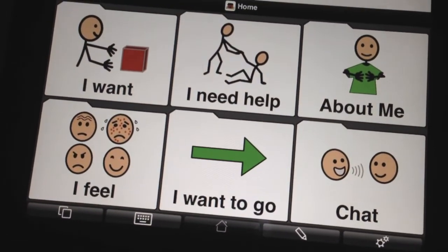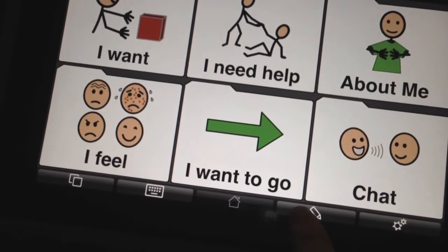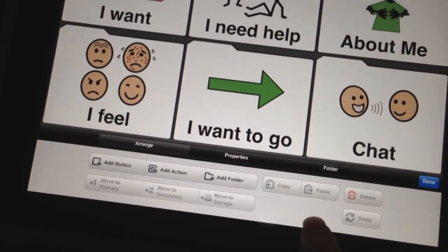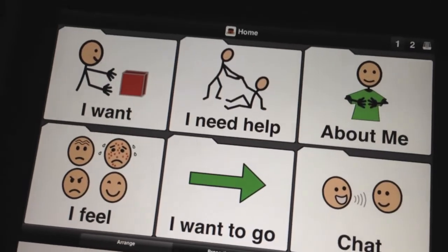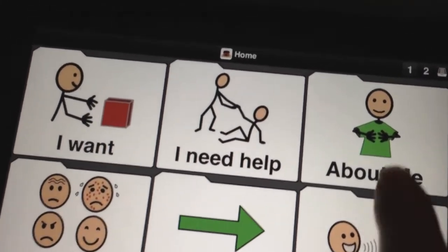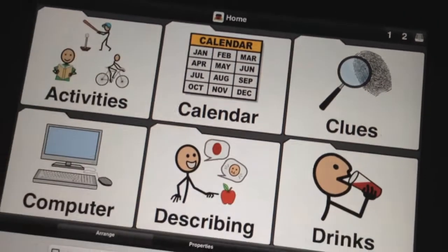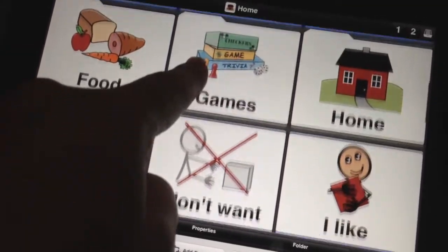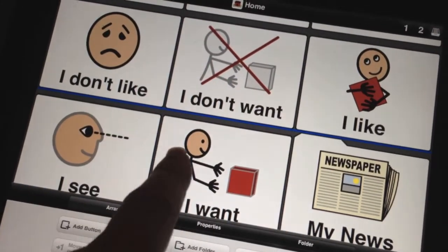or if you wanted to, what you could do is go down to your pencil button, your edit, and you can look in something called storage. Storage puts everything that they think could be used on this page in a little file cabinet for you. So you're going to press that button, and you've got a lot of options. These are all folders too, but if you scroll down more, you'll find that there's some buttons, the ones that don't have tabs at the top.